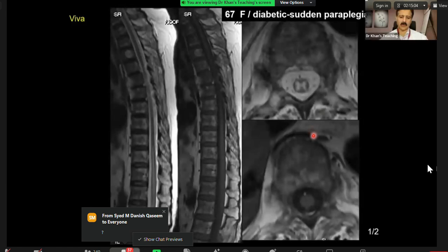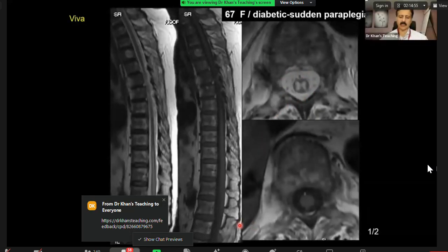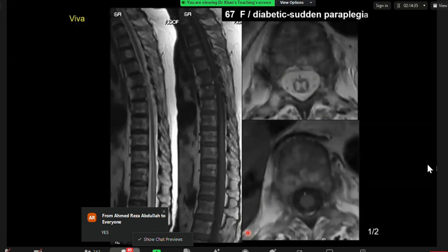You are right, but I want you to be very specific, very confident. There's a pattern here. Think anatomy, that's the hint from my side. You're more likely to knock off your anterior spinal artery. And there's a hyperintensity. So what is your conclusion? Concerned that this patient has had a spinal infarct. Infarct, okay.